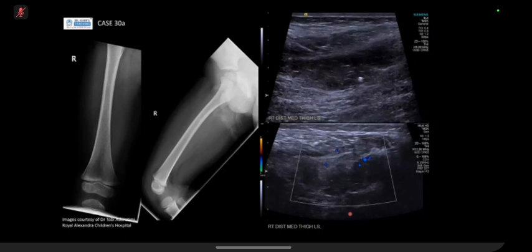Okay. So yes, this is not a hemangioma, but this is the other side. They are called vascular malformations. And I'll explain the difference in a bit. So you're right, these are phleboliths, and the reason why I gave the history, so they are usually just dysplastic vessels, okay? It can be lymphatic vessels, it can be venous vessels, normally, or a mixture of venolymphatics. Unlike hemangiomas, which are tumors, these are more ill-defined, and they also demonstrate very low flow.